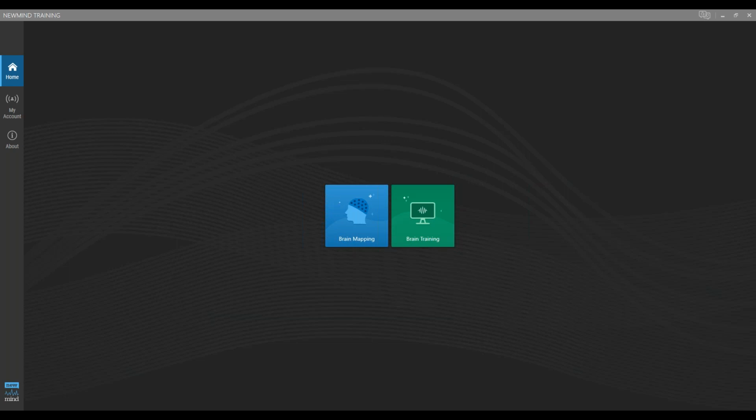And once we figured that out, the sessions improved greatly, as far as what I saw on the screen. Now, granted, that was years and years back when I was using BioExplorer. So I kind of had to figure that out, and that's the one thing I love about the NewMind software, that it blocks all that out. So you're actually going to get a good training session.